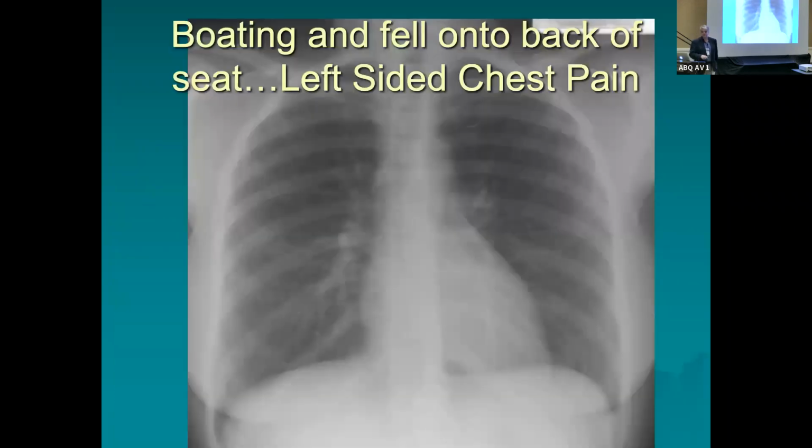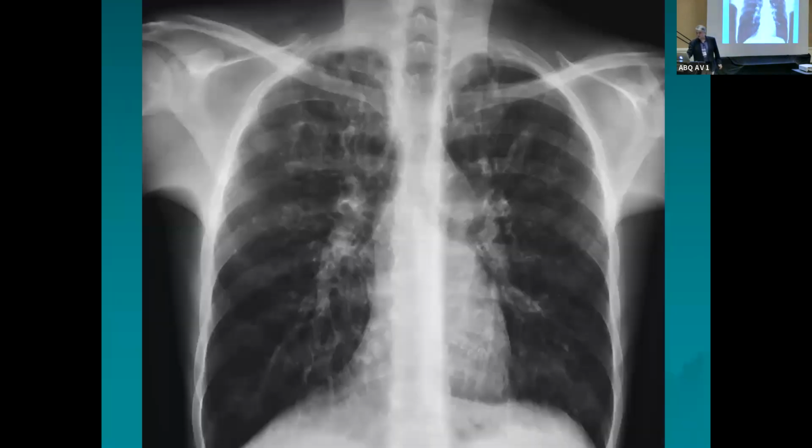Okay, this person was boating and fell onto the back of a seat, and they've got left-sided chest pain. Now, I know you're zooming in, left side right through here, but they've got chest pain. Let me see if I can actually see it on here. Yep. Boating, fell, ow, ow. Get this a lot. They boat, fall on the back of the seat, and there's actually rib fractures right in through there. So I don't think I've got any more that's zooming in there.